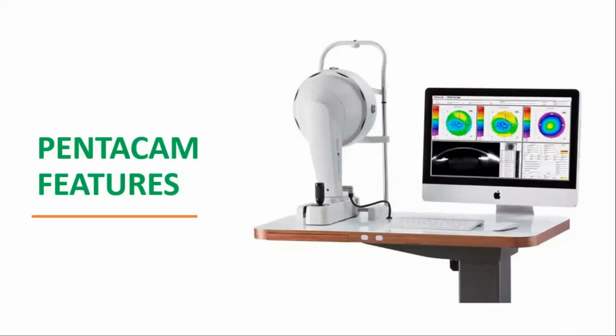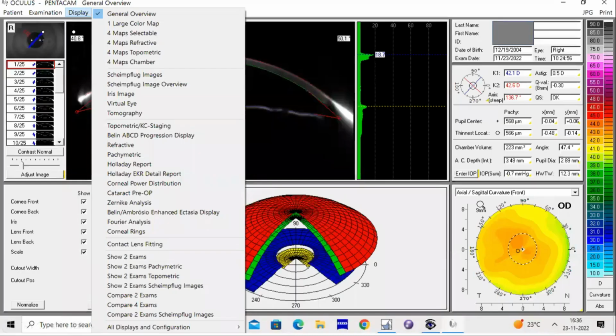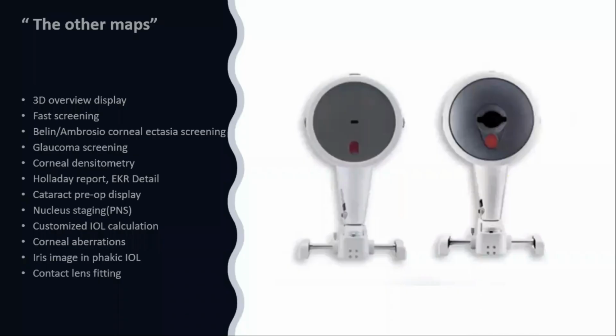So, in conclusion to the previous discussion about the basics and interpretation of the quad map in Pentacam, today I'll be focusing on a few more useful maps to look at in the clinics among the numerous maps which are seen here in the drop-down menu with one click. Other than the maps I described, the rest of the maps are permutations and combinations of axial, tangential, pachymetry, anterior and posterior float maps, similar to the quad map. So these are the maps we'll be knowing in detail about today.